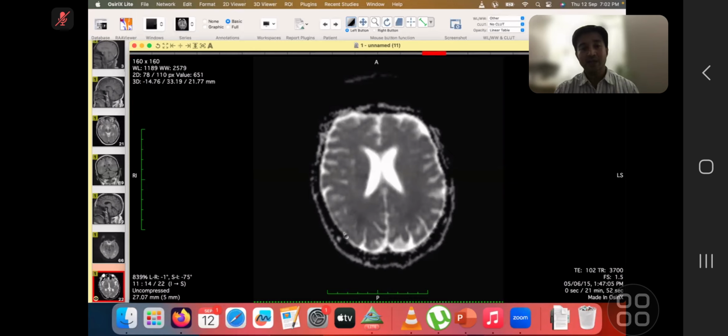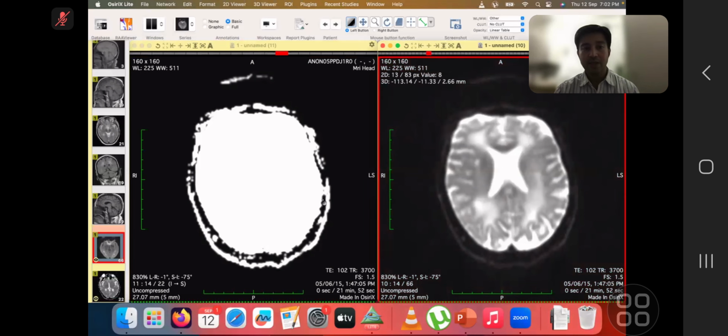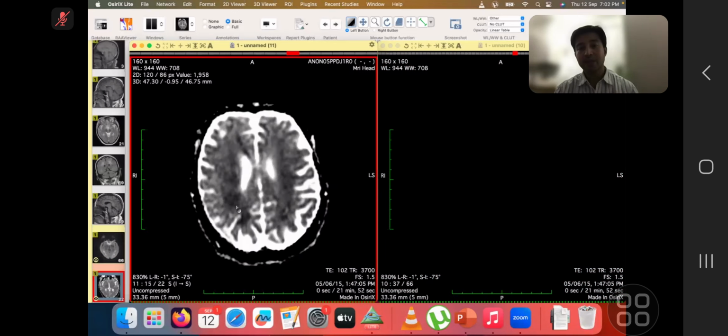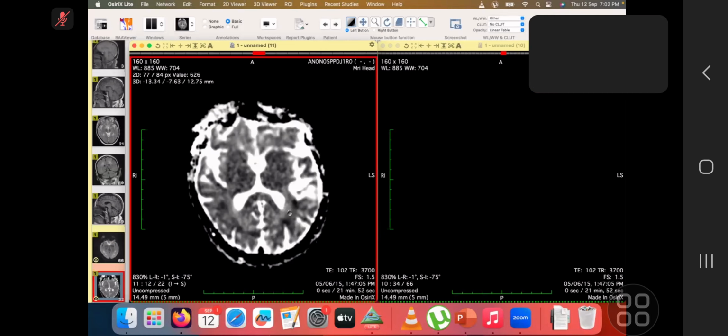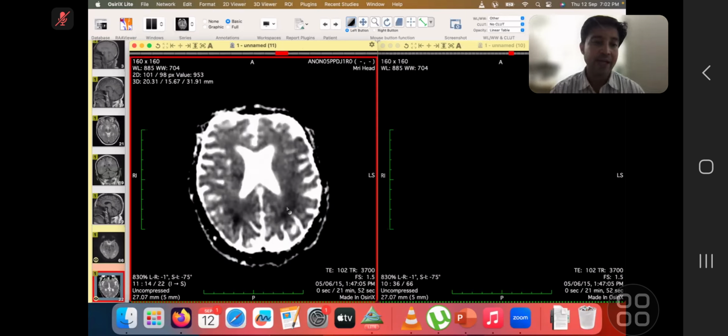If you see this, okay, I can see it now. Yeah, I think you need to adjust the window. Even in the exam, maybe you can ask the examiner that I would like to change the window and see.